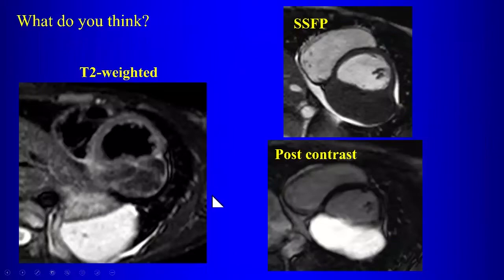This is a T2 weighted image, and then here we have bright blood and post-contrast. First, describe what we see. So there's marked enhancement, right, after contrast, there's marked enhancement of the lesion, okay? And on the T2 weighted image, what is the signal intensity of the lesion? It's hypointense. It's very low in signal. Most tumors are bright on T2 weighted imaging, but this tumor is dark.